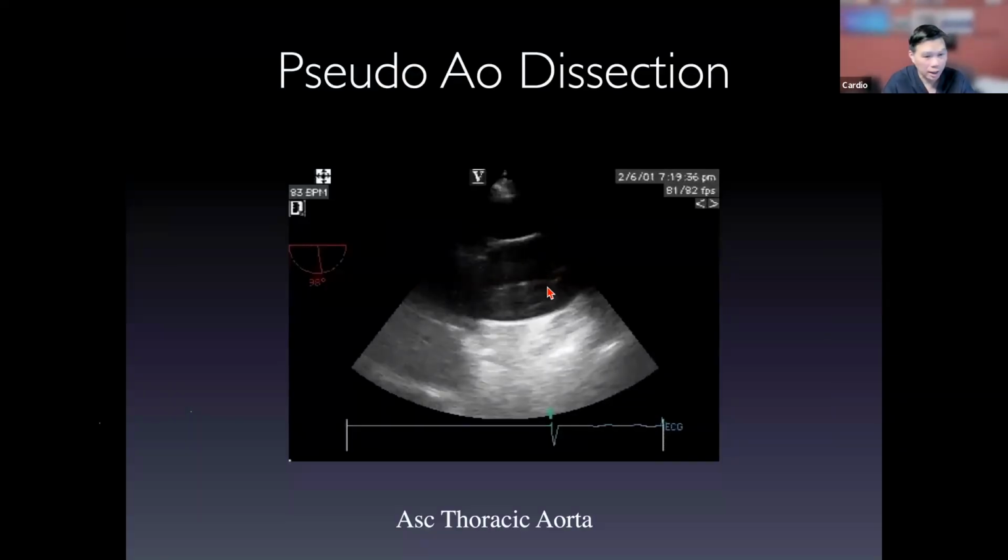If you have color that just flows through your artifacts or your line and doesn't respect the true lumen and false lumen, then it's very unlikely this line is truly a flap. Fortunately, this predated the CT scan, so I made the right call. So that is an artifact.